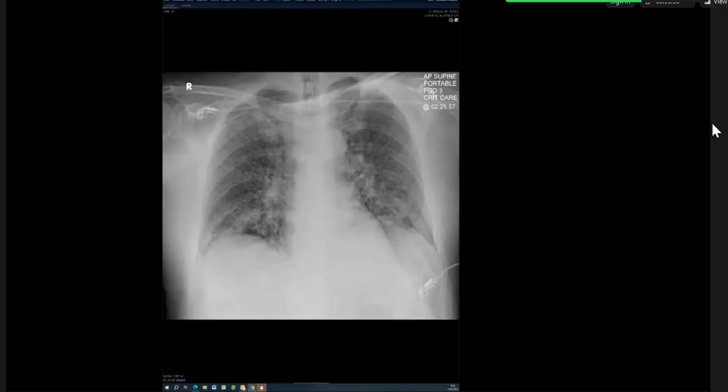So this could represent again cardiac failure. Nodules, cardiac failure. No, I think they are vascular markings, prominent vascular markings. Okay, so if you're saying all of these are end-on vessels and this is just pulmonary congestion, if that was true, why does he have an ETT and why are there no...? Why is the heart not enlarged?